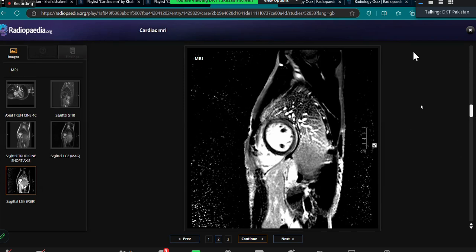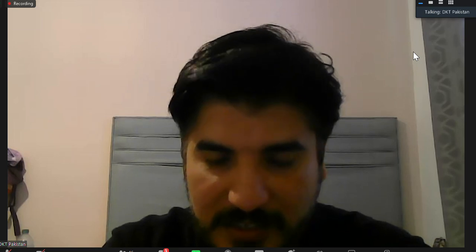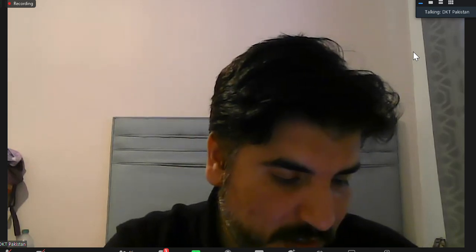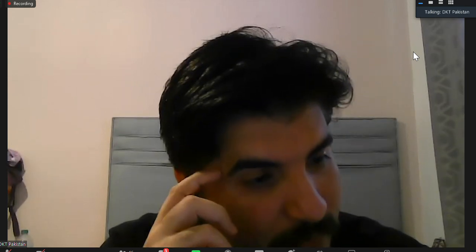Good. Let me show you one more case as well. This is one of the common cases that you can see in real life as well as in exam settings in cardiac diseases. Let me see what other case I can show you. Case number 12.